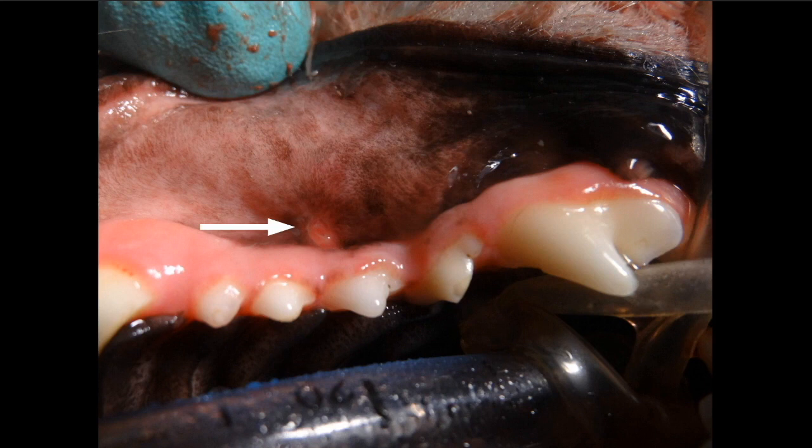Did you identify that little lesion? You've got some rotation on that third premolar, but the blatant thing there is that little lesion. So when you have something like that in the unattached gingiva, which is above that line of demarcation that you see at the butt of that arrow, you see that line there that kind of continues on. You've got pigment in the unattached gingiva, you've got the lesion in the unattached gingiva, and then in the attached gingiva toward the crown, you don't have any pigment. That is the line of demarcation in this particular patient.